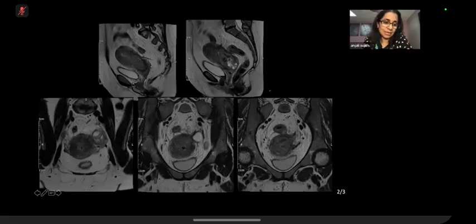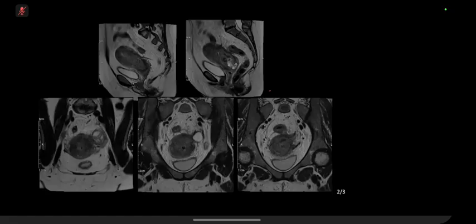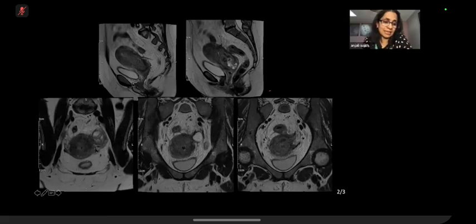And what is happening to the left adnexa? I think in the left adnexa, is that involving the left ovary within the mass? It looks like it is extending to infiltrate into the left adnexa. And what about this slide? What is shown in this slide?